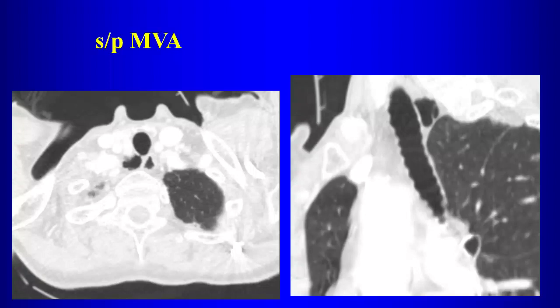So this is called what? This is a tracheal diverticulum. These are very common. Often we overlook these, but start looking for these on CT scans. You'll see these very commonly. It's usually one of those things that you don't notice until somebody points it out, and they'll always point it out, and you'll confuse it with something terrible. You don't want to do that, okay? So this is a tracheal diverticulum.